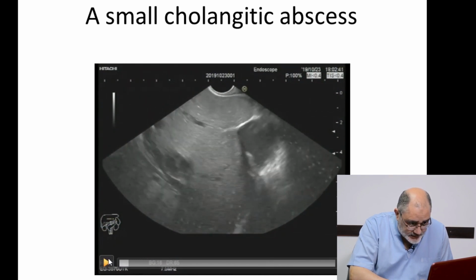Okay, and this lesion is between, again, the ligamentum venosum and the middle hepatic vein. So it is located in segment 4. This is segment 1, caudate lobe, and this is segment 4, and this is segment 8 below the middle hepatic vein.